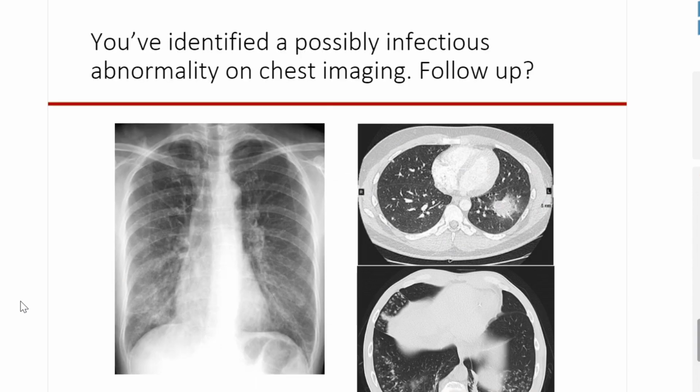Okay, so this is sort of the typical PA radiograph where someone could say, oh, I see some patchy opacities. And for me, I don't know what patchy opacities mean, because if you look at many of the books, the lexicon for patchy means scattered, which is fine. I see scattered irregularities on that chest x-ray.